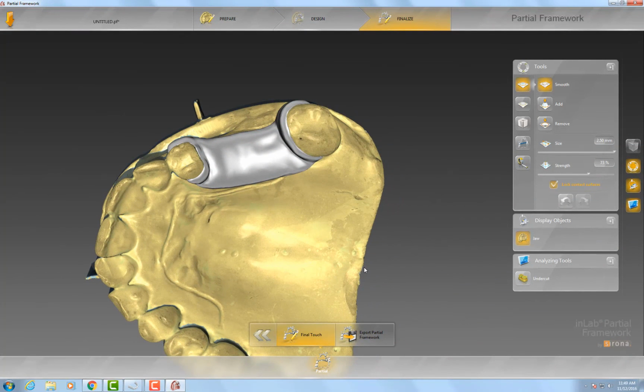So one thing that we also had to do was have a block out for our teeth. So you're generally going to set your teeth here. You're going to set your teeth there. Now I usually do about 2 or 3 of these. And you're asking me, well, why do you do this?